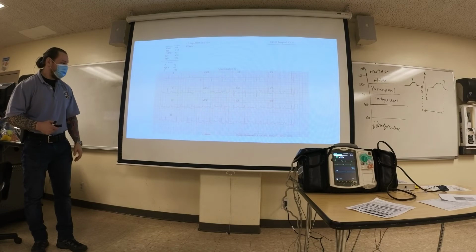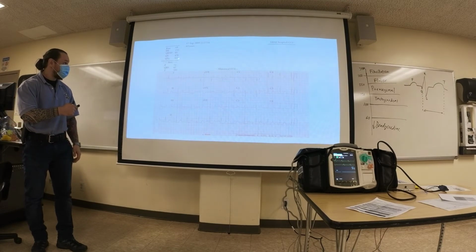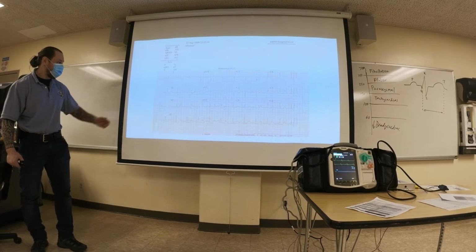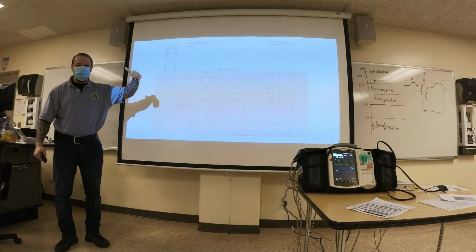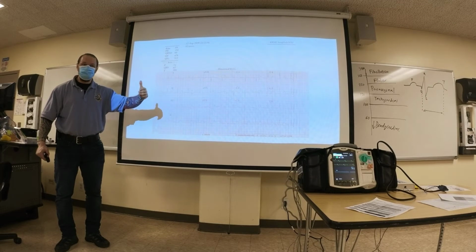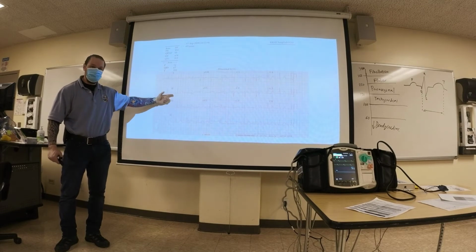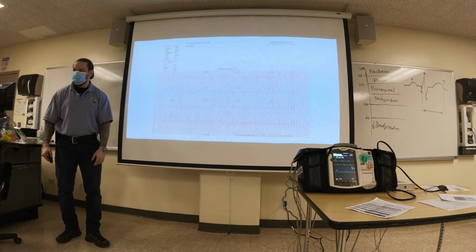So what I do is I do this, and then I look right here. So it says 512 milliseconds. Is it normal or prolonged? Prolonged, right? So keep in your head, the longer the QT interval, the higher the likelihood of them going into Torsades if there's an ectopic that falls here. Any questions so far? Clear?